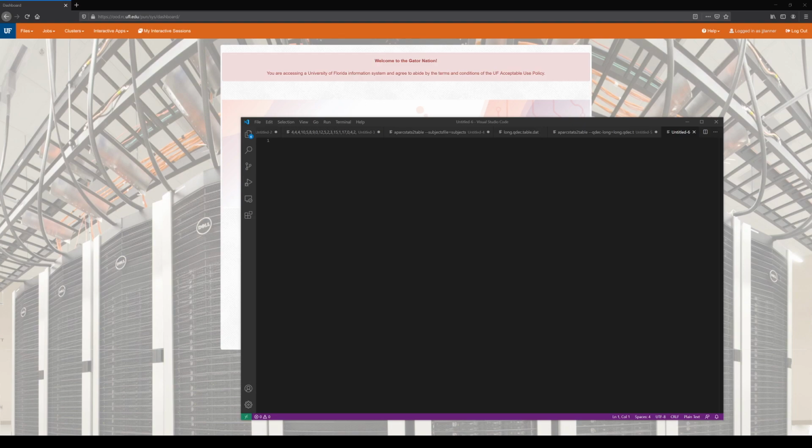Okay, we're going to learn how to process the brains using FreeSurfer. We'll do it on HiPerGator. We're going to do 3 brains from the set of participants of brains that we had dealt with. We had copied over into our subdirectory and extracted those and had viewed them.